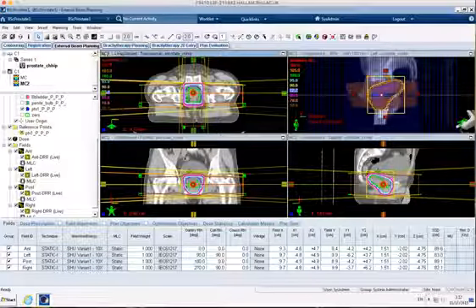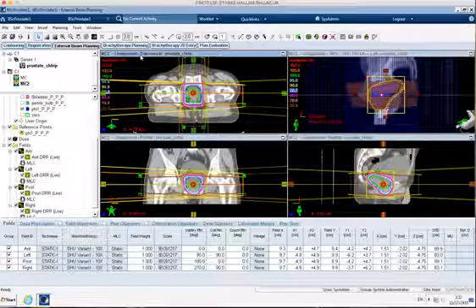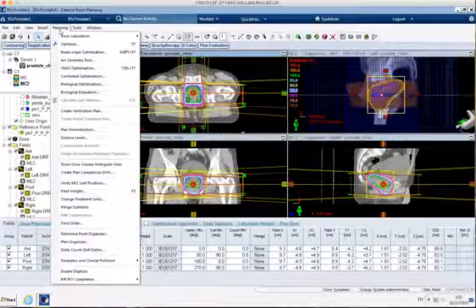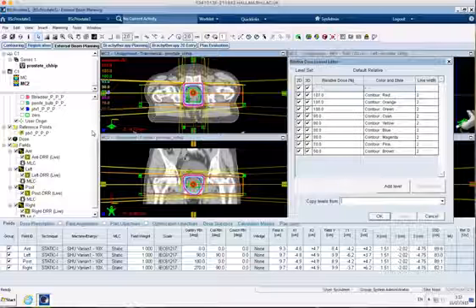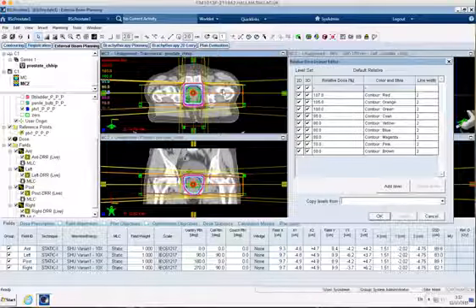So what I'm going to do, just to make viewing things easier, is to make sure we've all got similar views in terms of our dose distribution. So first thing we do is sort out our isodoses. So we go planning, isodose levels, and this is something that you might change quite a few times. So we can tick and untick as many isodoses as we want on at a time if we think it's too busy or we need to see some more information.